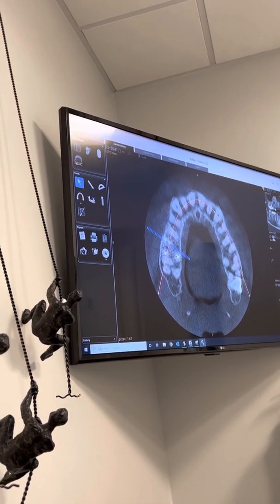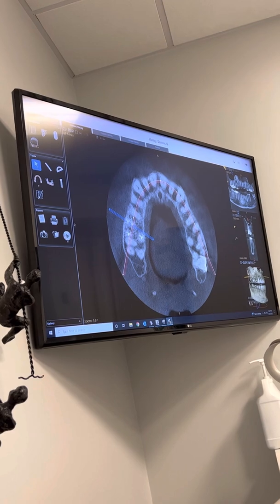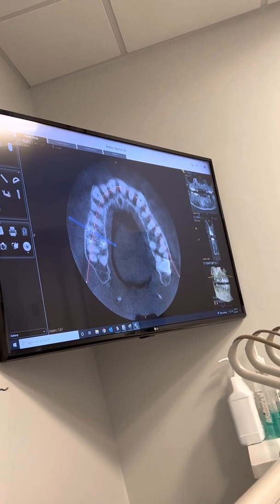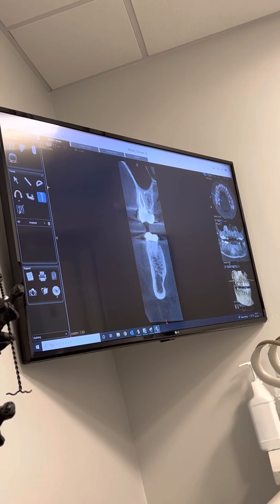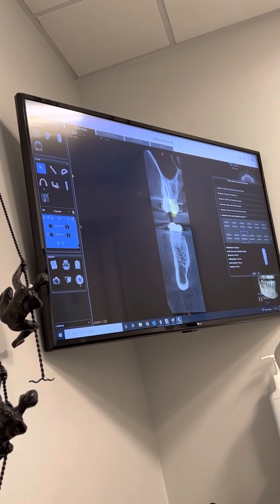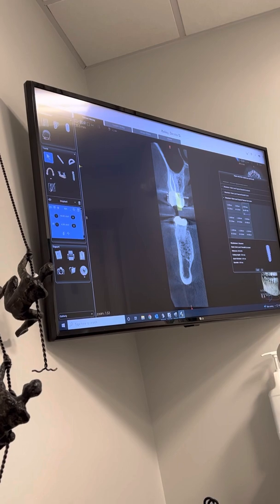One-stop shopping. And then it gets a custom healing abutment on top of it too, and this is a pretty straightforward thing to do. We just have to really take a second to plan it to make sure that you have the appropriate bone structure to get it done. So what I'm going to do next is just hypothetically put an implant in. You can already see that from your bone level to the floor of the sinus is at least 9 millimeters. So let's go ahead and put in an 8 millimeter implant.